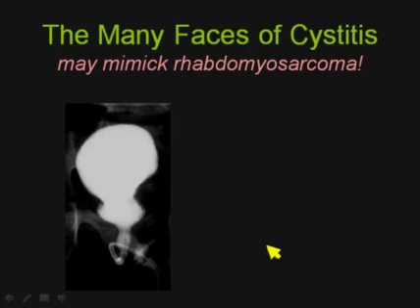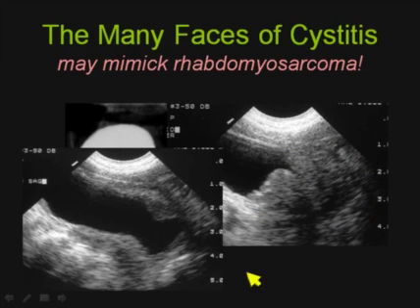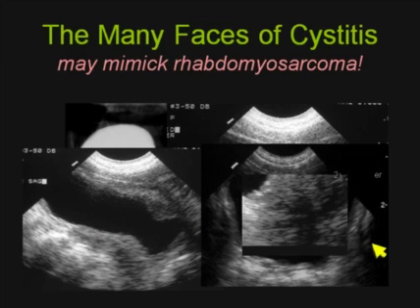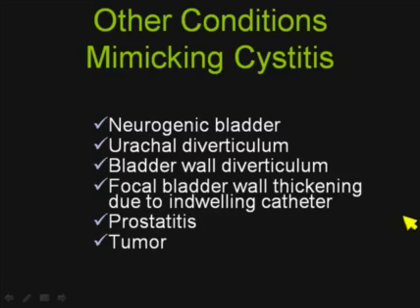Sometimes the bladder wall will look like there is a constriction and be highly suspicious for a mass, but on ultrasound we see something that looks very suspicious as well. But as the bladder fills, we see that the size of this so-called mass actually gets longer and more slender, and that centrally we can see the lumen of the bladder. No tumor would do that. And then just about 2 weeks later, these findings have completely resolved.